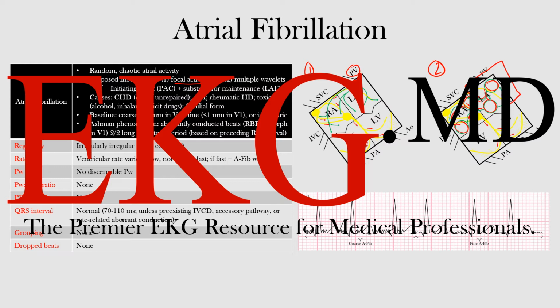So again, we're saying there are no discernible P waves. If you look down here at a rhythm, there are no P waves that you can make out that are complete, okay?